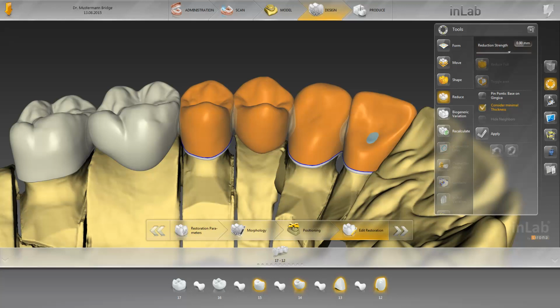The reduction area can be customized, for example by entering a short collar around the lingual and proximal sides. Start by double-clicking. Determine with the blue line the desired area. The lines can be fixed with a single click. Finalize by double-clicking.